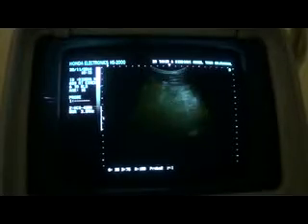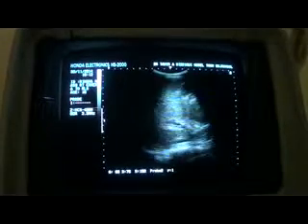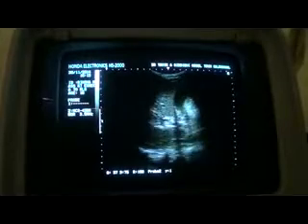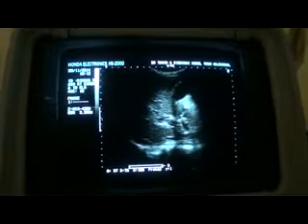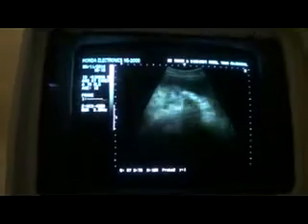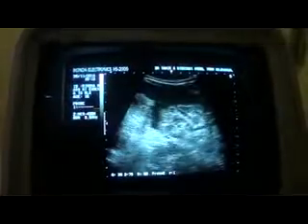Okay, now there are findings. Number 1, the cavernous transformation of the portal vein. Here it is showing you again. Ascites, matted bowel segments, attached with the mesentery. Here you can see that.